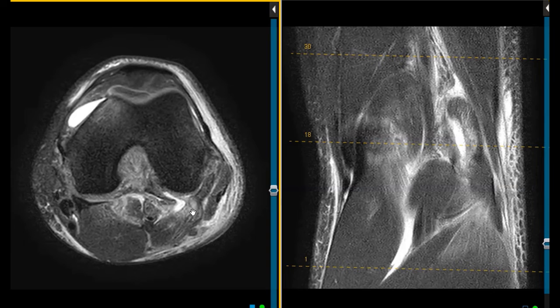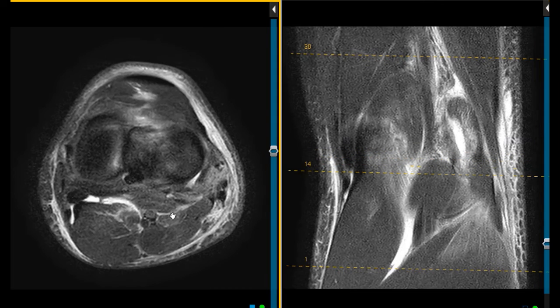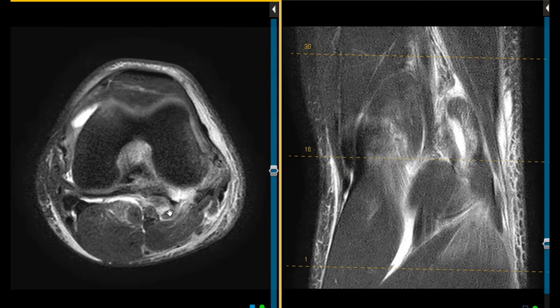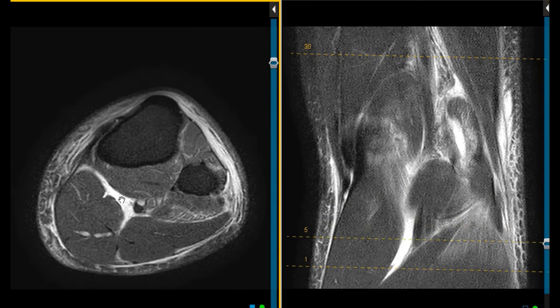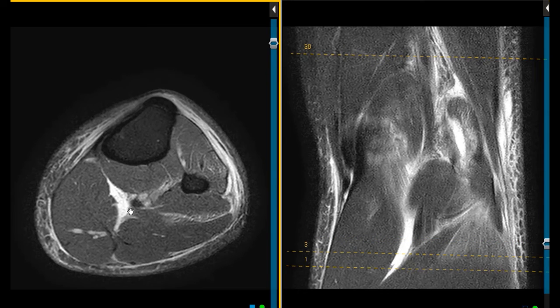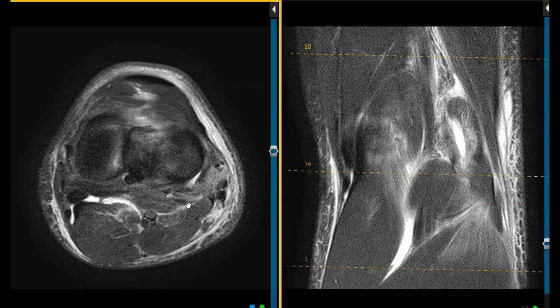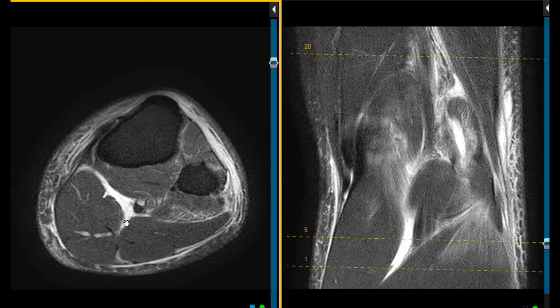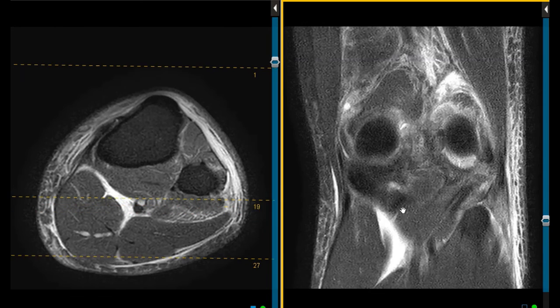So it looks like this lateral gastrocnemius, partially torn, and the plantaris, which is a small muscle, very hard to see, maybe right here, is torn as well. And there's a tendon from the plantaris. Maybe this is part of the plantaris here. The tendon will come down here, it'll shoot across, and usually go down in here. And instead of seeing a tendon down here, a really tiny tendon, we just see fluid. So this is hemorrhage or edema, and this is a common finding with a plantaris muscle rupture. So the plantaris, when it tears, it will have the fluid leak down in here, and we see a little band of fluid just like this. So this is a little sign of a plantaris muscle rupture.